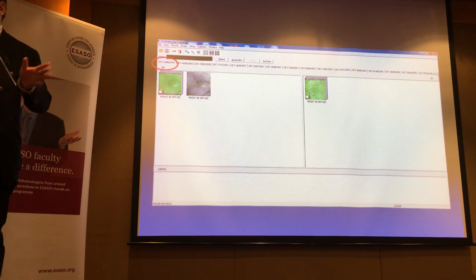Right? And why was that missed? Because patient not cooperative. Granted, I agree the patient was not cooperative. We've all had patients, right? Moving eyes everywhere, you get a 1.5 second view at a time. Senile ptosis, lids getting in the way, blah blah blah, tearing. It's difficult, but this was the clue. So yes, there was no macular edema. The DME was under control, but the diabetic retinopathy had progressed, and there was a clue.